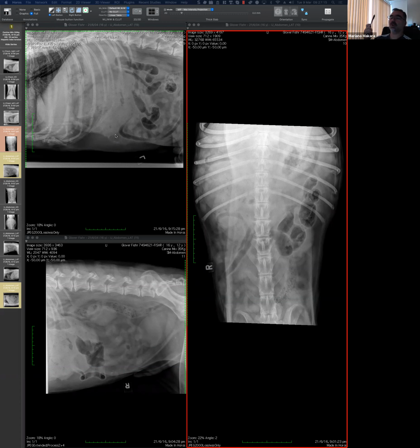And this is just to recall a discussion that I would probably have in the clinic, or if I'm at home and someone is working on this case. I would probably ask them, because that is a very important concern. I mean, it's very important to be sure if there is free gas or not. I would probably ask them, and I answer the question that I asked. I think it's very easy to miss a small amount of free gas. I would probably use a horizontal beam in this case.